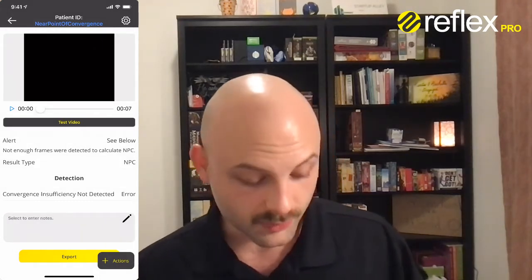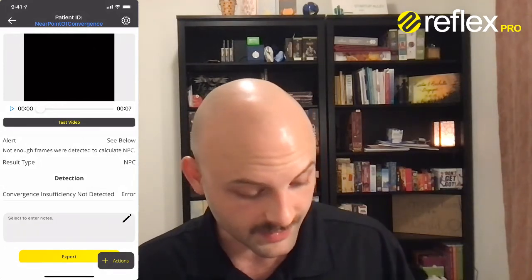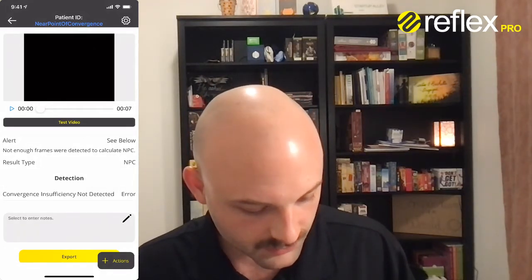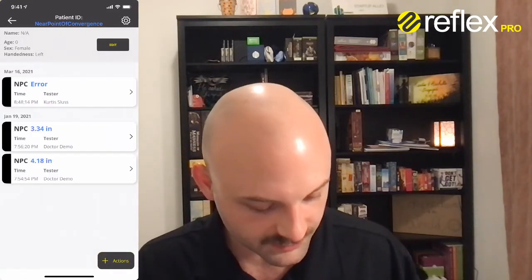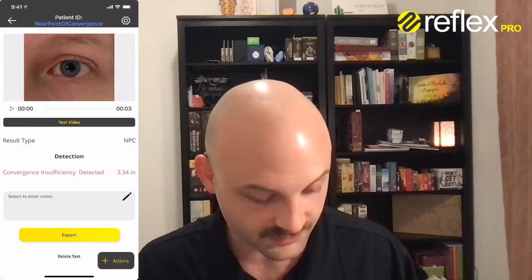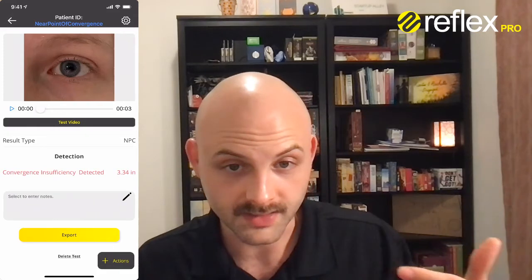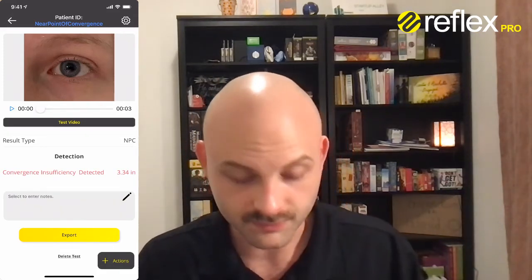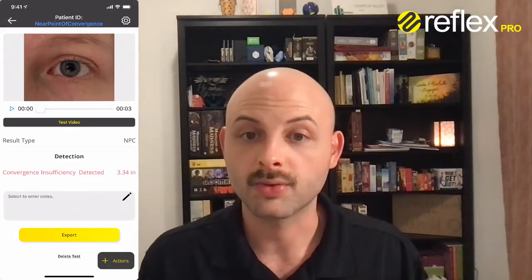Once that's completed, you'll be able to see and review the video and then include notes and export the data. So since there wasn't an actual eye there, that will result in an error. But let's look at a previously taken test. You can see that you can review the video and look at the framing as the eye punches in, and then also get your recorded value.